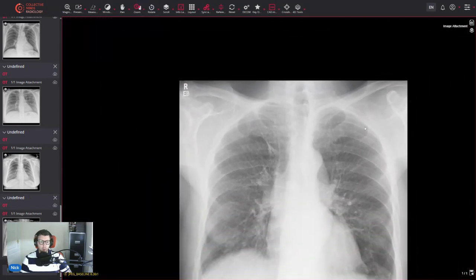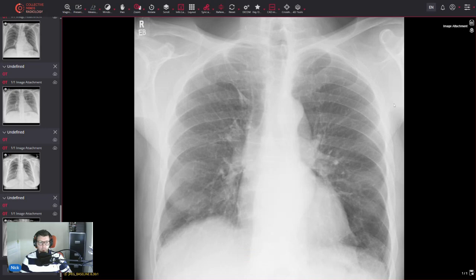It's an azygous lobe, and to be honest, I don't mention them in the reports. A lot of people don't, especially when it's primary care, because it can confuse the issue. But it's worth knowing what it is so you don't confuse it with a lung nodule.